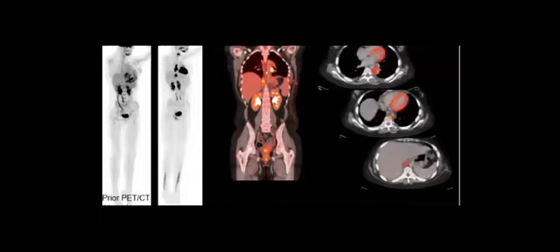And he showed you the CT. So can you localize where exactly in the vertebra? Is it in the vertebra or is it outside? No, the heart, it can be like this. No, it is not. And salivary gland as well. No, it's not. Sorry, the Waldeyer's ring. So no. So do you agree that the pathology is here?